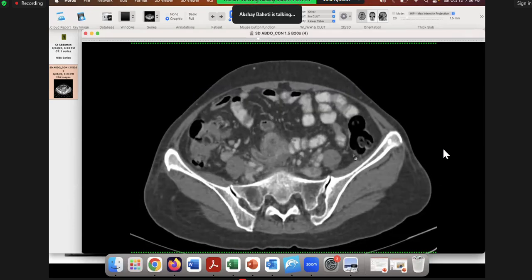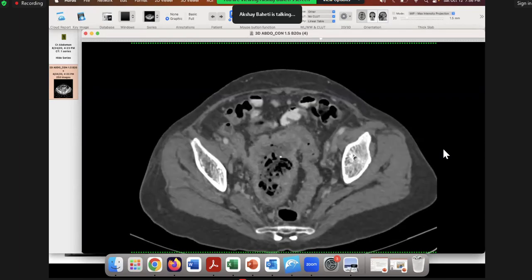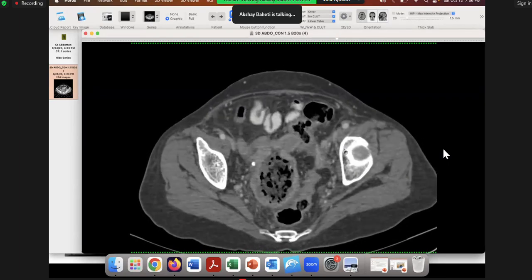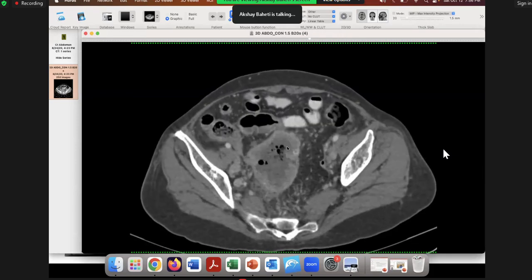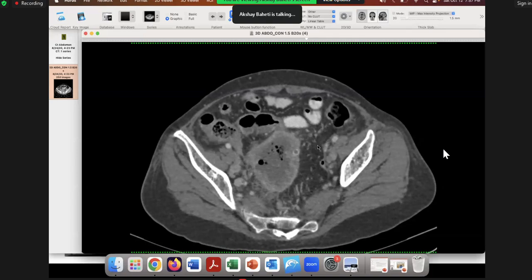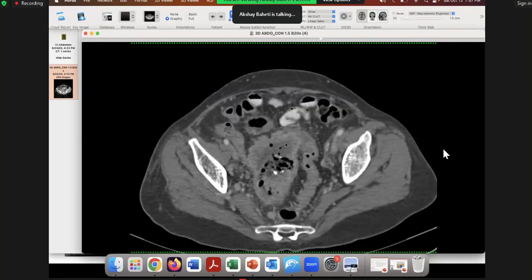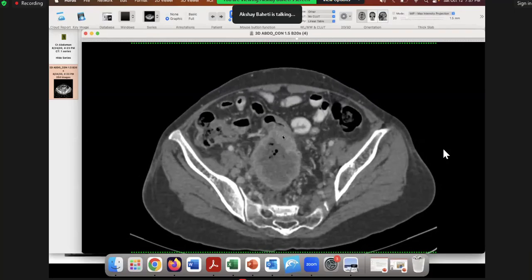So this could be a long-standing teratoma. You won't see it in a 20 or 30-year-old. With teratomas, the longer standing they are, the more likely that they will undergo malignant change. In a 50 to 60-year-old with a teratoma which has not been excised, there is a possibility of malignant degeneration or squamous carcinoma arising from the teratoma, and that could involve the bowel. And that is what has happened here.